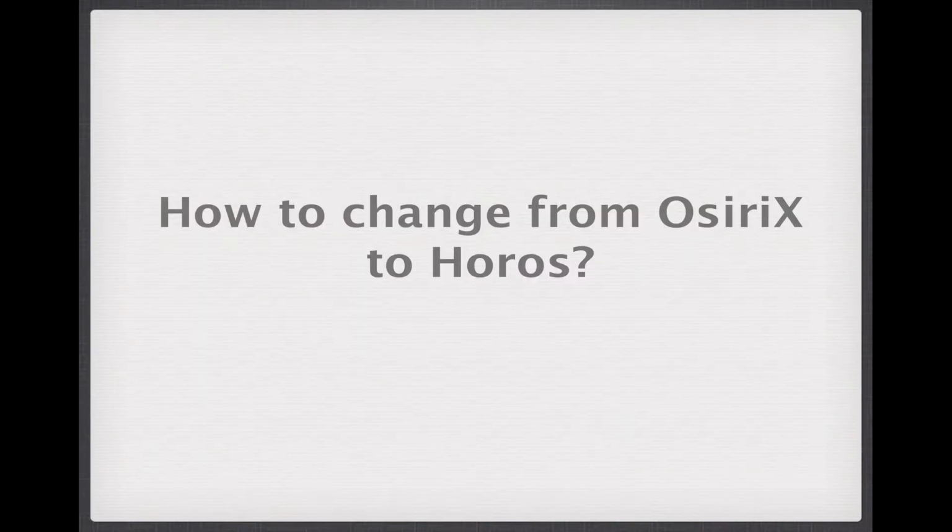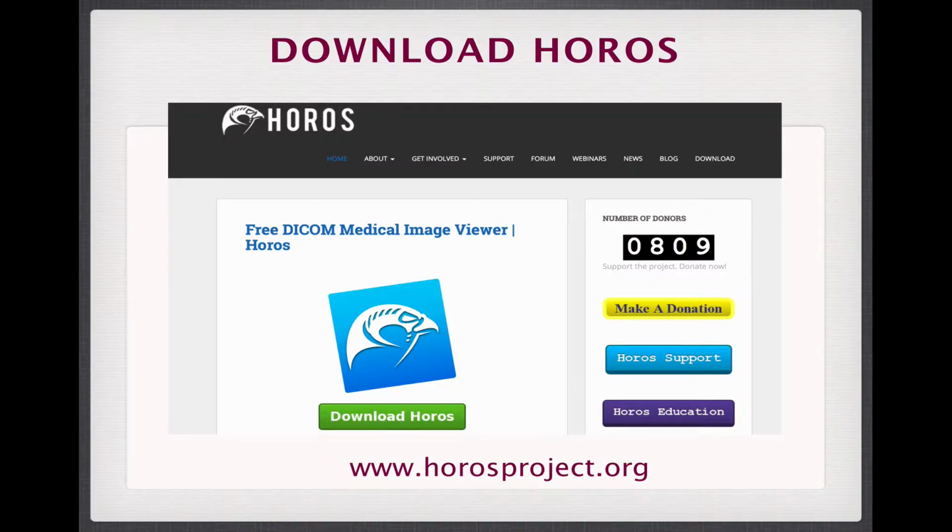So how do you make the change from OsiriX to Horos? Well, the first thing to do is to download Horos from the site. Here's the address that I've shown you, and as I mentioned before, it is possible to make a donation to continue to support this company.